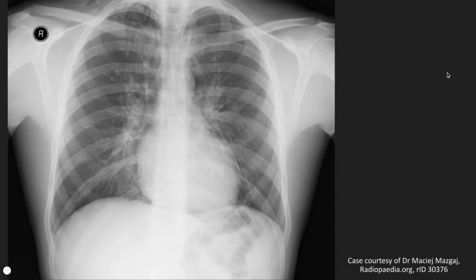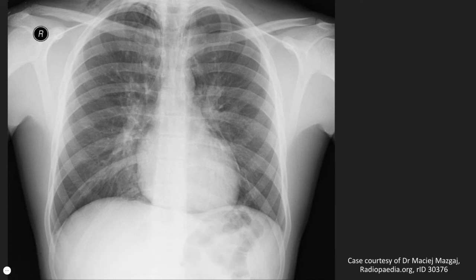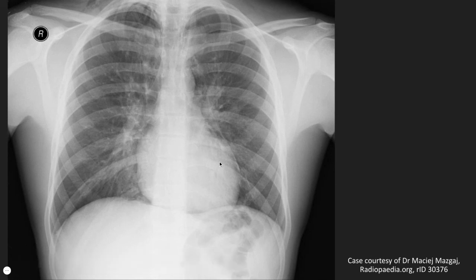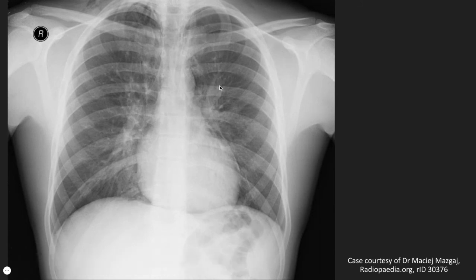In this case, we revisit something I showed right at the beginning of the presentation. If you notice that there is lifting off of the pericardium and the continuous diaphragm sign in keeping with pneumomediastinum, then well done. If not, then review of the soft tissue should reveal subcutaneous air in the right supraclavicular region, which should then lead you to have a closer look at the cardiomediastinal contours and hopefully another chance at picking up the pneumomediastinum.